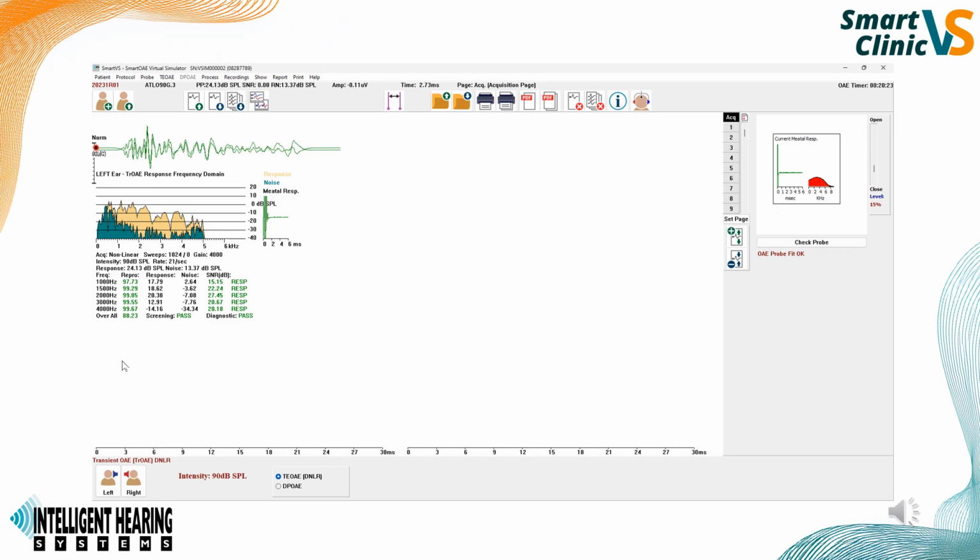You can look at it at the top in terms of the time domain, and right below it you will see the frequency domain, where the yellow is the emission and the teal is the background noise. The results can be shown on the right-hand side, indicated by the response.